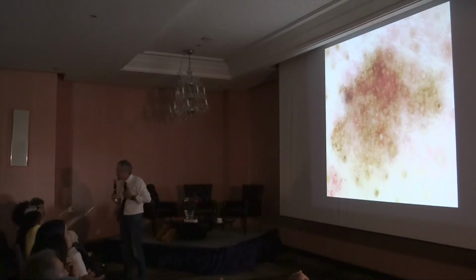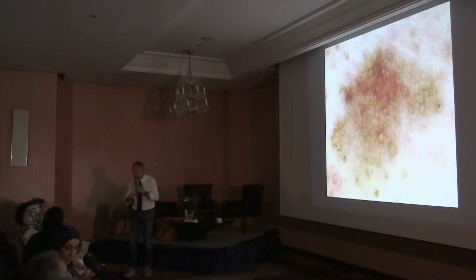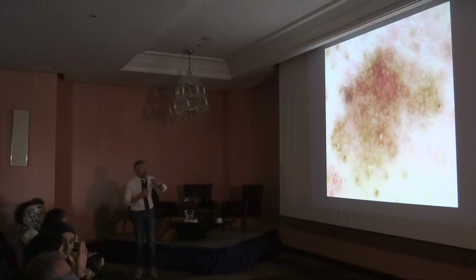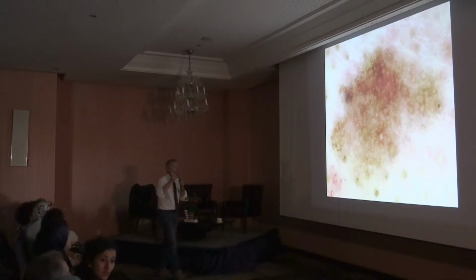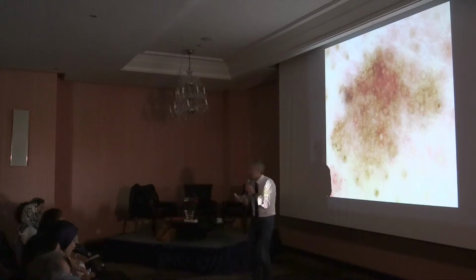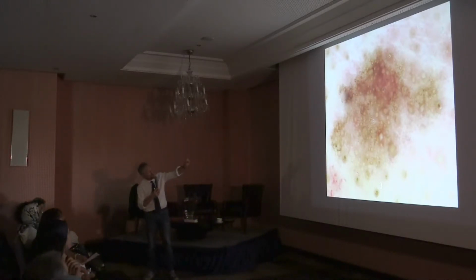Yes, but not so many circles. Look at the quantity. The point is, this is not the problem of the circles. This is the problem of the absence of benign features. Even though you see clearly the follicles, they are not white.